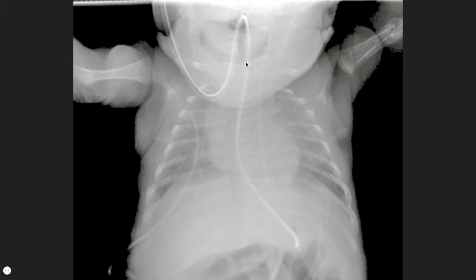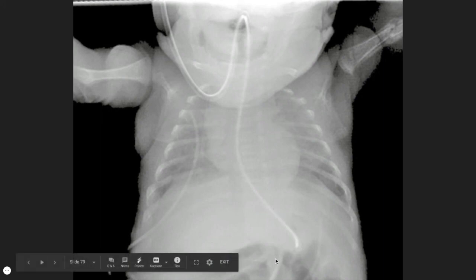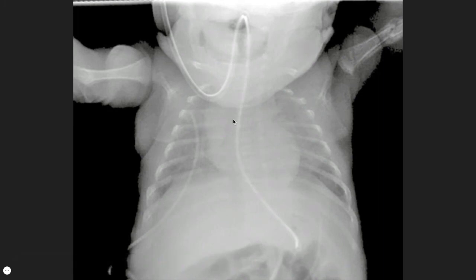The nasogastric tube, which is the main focus of the study, descends inferiorly in the midline, bisecting the carina and coursing below the diaphragm and the expected location of the gastroesophageal junction to sit within the stomach. The airway, which is less well seen than previous examples, appears grossly normal. The lungs are low in volume, which is likely a result of a poor inspiratory effort. The lungs look busy, which is a result of crowding of the vessels. And there is no focal abnormality as we check our lung zones in turn.